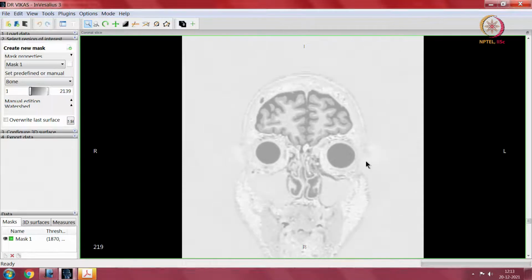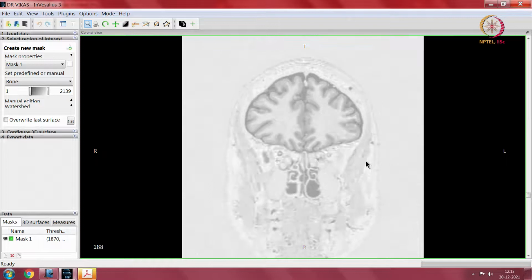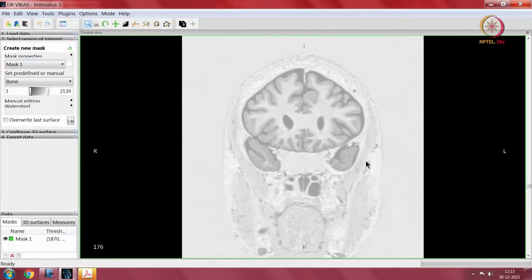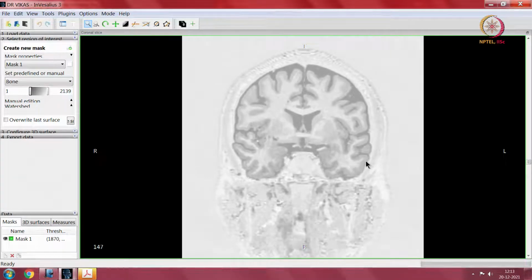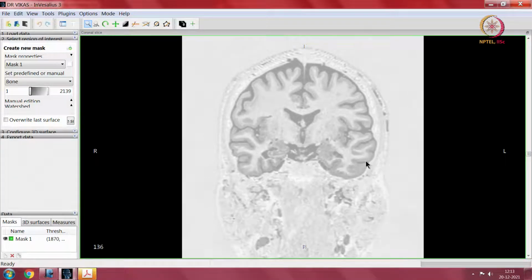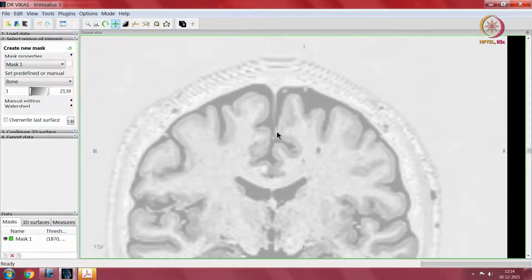So, now once you have got a fair enough orientation of what axial, coronal and sagittal means, I will start with something again which we know. So, in my 3D demo, I had spoken to you about this separation which is there between the two halves of the brain. So, here you can see the structure, that is the falx. Okay.